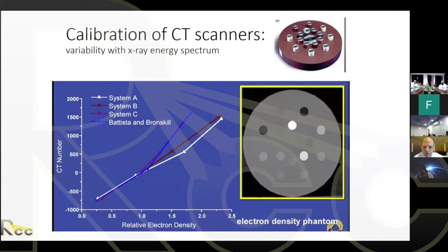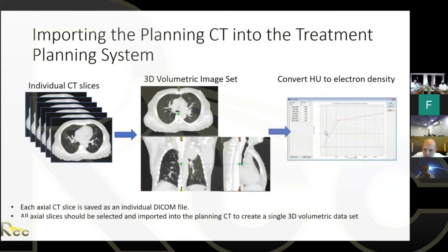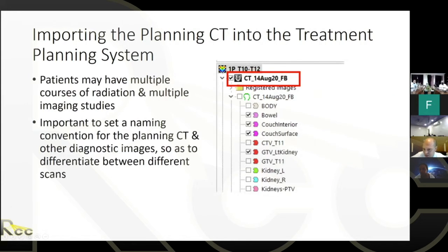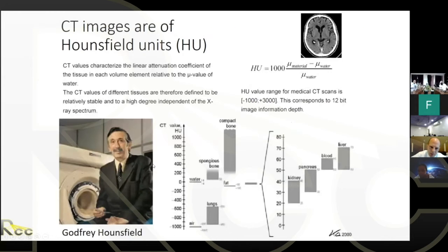But the question I think is asking about tissue density, which is related to the Hounsfield unit or CT number, correct? But you're comparing, and the planning system will have, this is a plot from our planning system, and you can see there, this is a relative density. So this is an electron density plot here. Our planning system asks for electron density for that calculation. So we have a relationship between Hounsfield unit and relative electron density, which is different than physical density, slightly different, but it is different. And so you should know what your planning system is asking for. Is it asking for physical density, or more likely it's asking for relative electron density? And then you put that relationship in, which is going to look something like this.